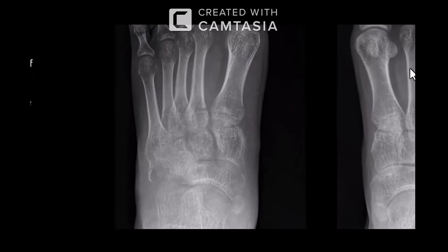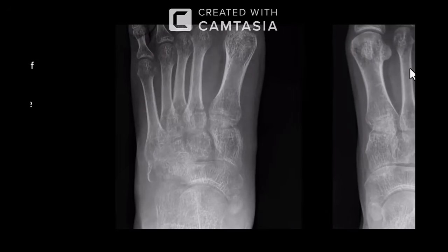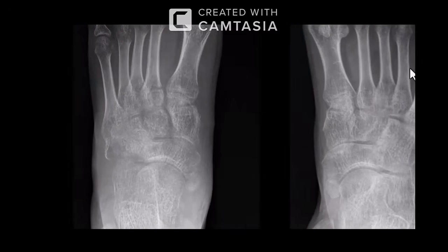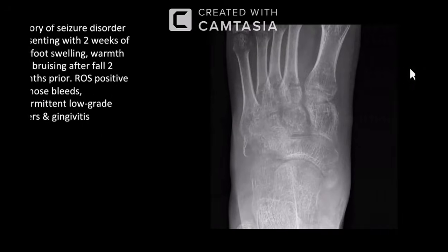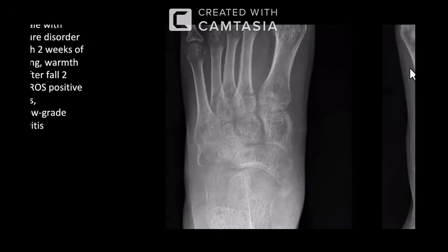Do you still feel it is a Lisfranc injury? How about the bone mineral density in these cuneiform, the medial cuneiform, the navicular bones? Do you think it is normal? No, for the age of 18 years old, it's not normal. It looks less dense than usual. Do you still want to keep this Lisfranc as one of your differentials, or any other differential you want to add?